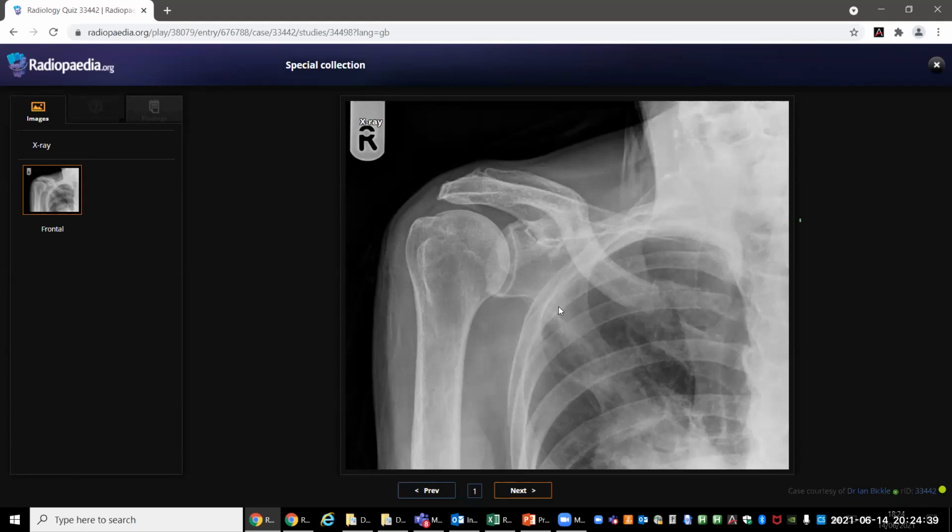So these could be due to lung metastasis, or primarily it can be a rib lesion with a metastasis to the lung. First of all, I'll suggest a CT or a chest X-ray of the same patient to look for the size of the lesion, and furthermore, the patient needs workup for malignancy and also a metastasis protocol like CT scan of the chest and abdomen.